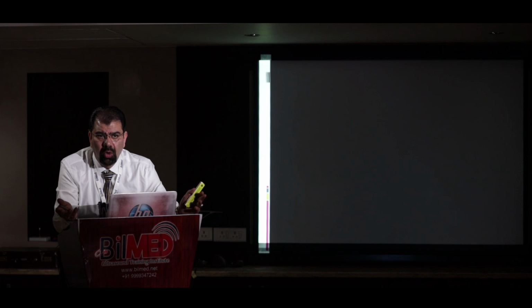And you are seeing no yolk sac at all. It does not mean that there is no yolk sac at that particular time. Maybe there is a very small 0.5 millimeter one, already regressed, that the ultrasound is not picking up. That is also possible. Ask yourself why this fetus is normal, why this is beating. He had some food maybe yesterday and he is alive till now because of that food, and tomorrow you will not expect that fetus to be live.